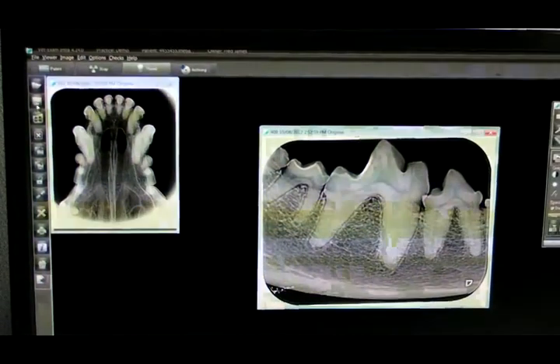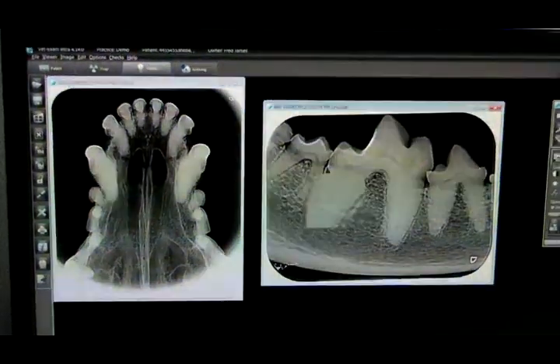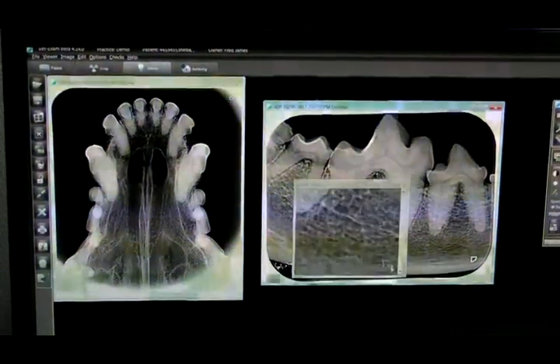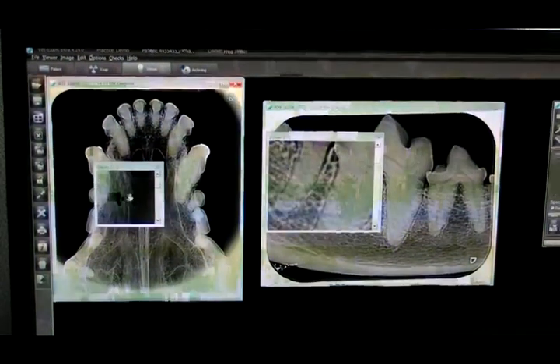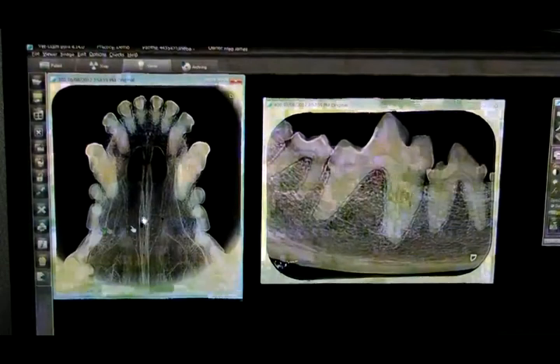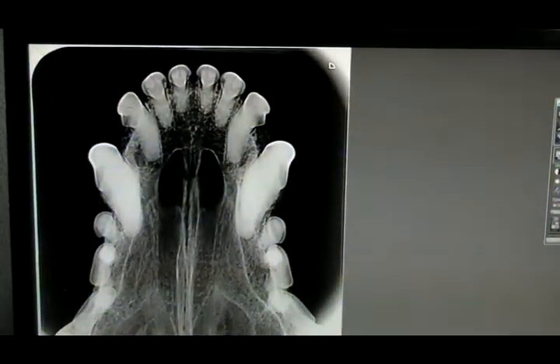You can then save the image. And again, the same on this one. You have right-click zoom to zoom in. You can change the zoom size of the box. Again here. You can bring this full screen by hitting this. To go out, hit the cross.